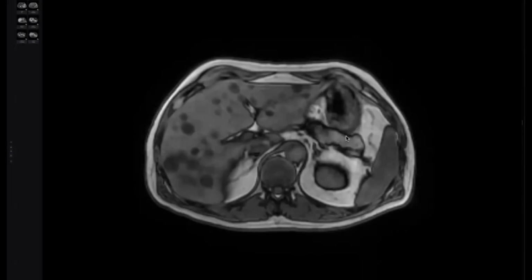Look here, if you want it scientifically, search for this Indian ink. By the way, Doctor, what is the name of this phenomenon? Chemical shift. What is chemical shift? I will help you.